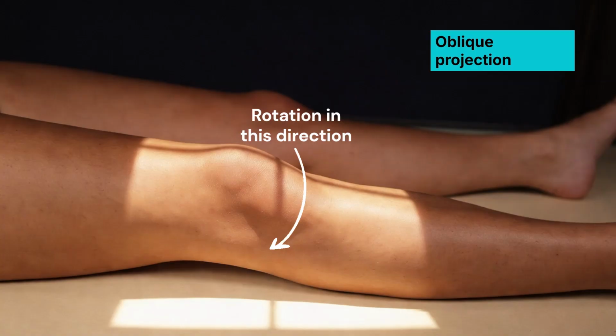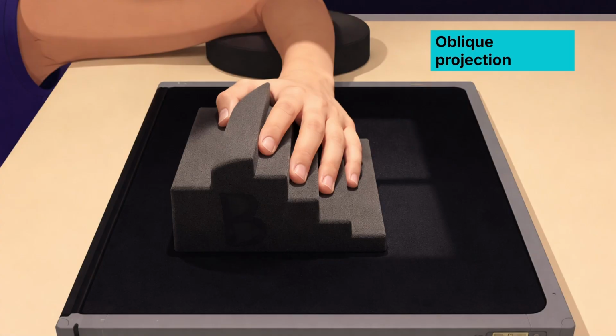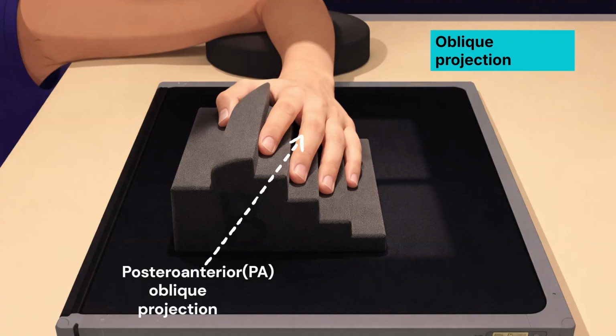Only the perspective does. It is also important to understand how oblique projections are named. Naming is based on which side of the anatomy is closest to the detector. For instance, in this illustration, this is an anterior oblique projection because the anterior side of the anatomy is closest to the detector.